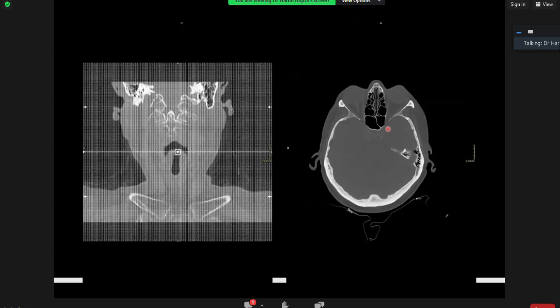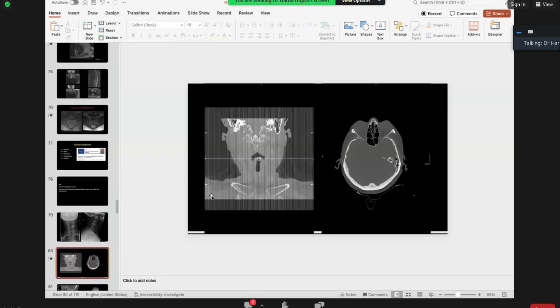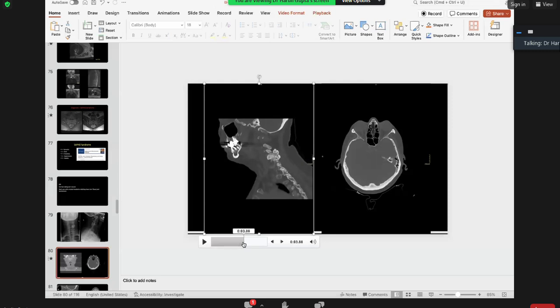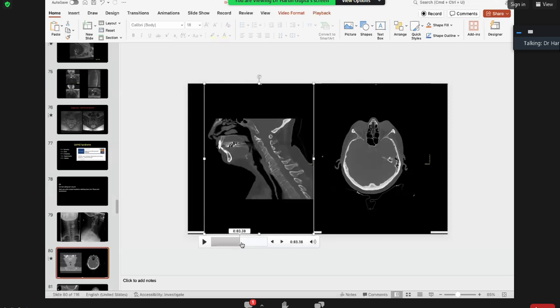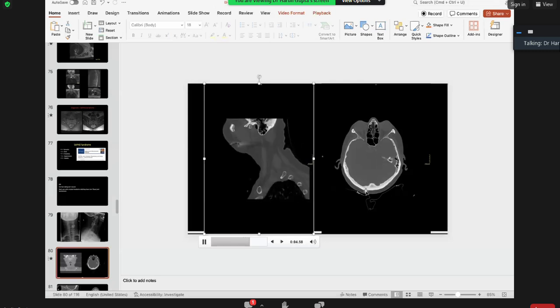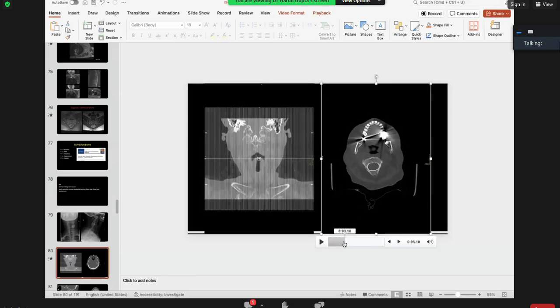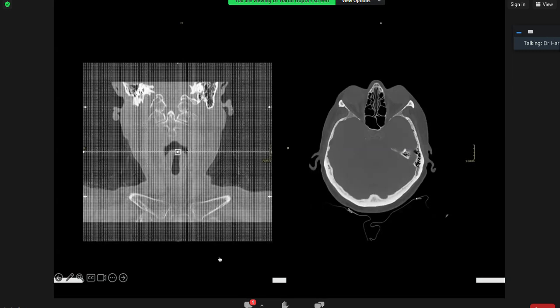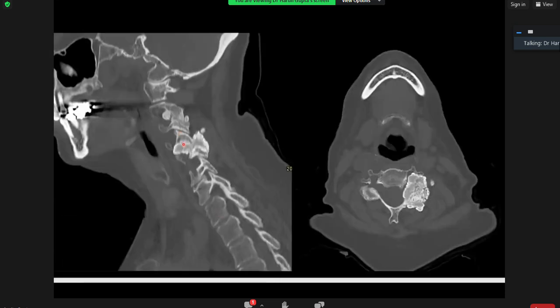So we get the patient back for a CT scan. I will have to come out of the presentation just to show you the CT scan. When we look at it, there is all this calcinosis centered at the facet joints, producing severe foraminal stenosis. Now let's get back to the presentation. So what we have found is extensive calcinosis and severe foraminal stenosis.